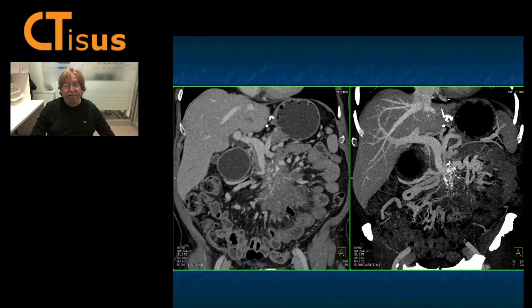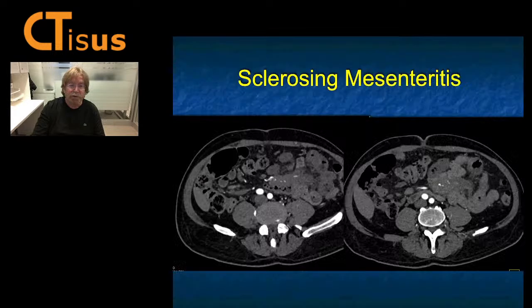I can think about lymphoma. Lymphoma tends to displace rather than invade vessels and narrow and make irregular vessels. What gives me irregular vessels and malignant? Then I'm saying carcinoid. But what else could this be if it wasn't a carcinoid? A met? Maybe. What about sclerosing mesenteritis? That's a whole other diagnosis. But this was sclerosing mesenteritis.